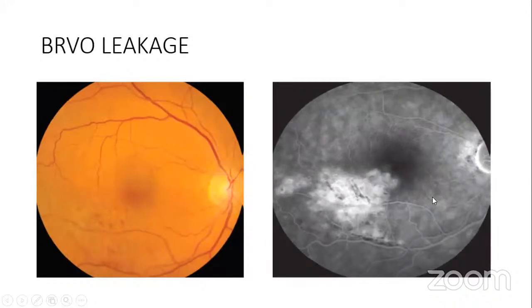Now, in the fundus angiogram, now guess the timing in your mind. That will tell you what's going on. The vessels are empty. They've emptied out. It's the late phase. Okay, just some staining. But you see this pattern of hyperfluorescence here that is encroaching towards the macula. So the person had a branch retinal vein occlusion and you had leakages of dye from the tortuous vessel into the retinal tissue. Okay.